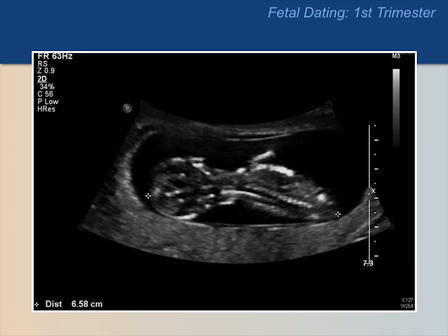Please pause the video again to invite a volunteer to assess fetal position, profile, and caliper placement. The answer is that the fetal position is not neutral and we cannot see the face. The calipers were placed correctly.